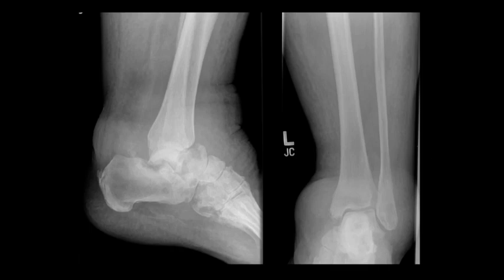Here we have a large amount of swelling around an ankle. We've destroyed Kager's fat pad. We've lost most of the talus. So we have kind of like the talonavicular joint. This region's still alive, still going. We have septic arthritis involving the subtalar joint. So where's the subchondral white line there? Where's the rest of the talus? All that swelling, septic arthritis of the ankle, and likely there's some change down here as well.